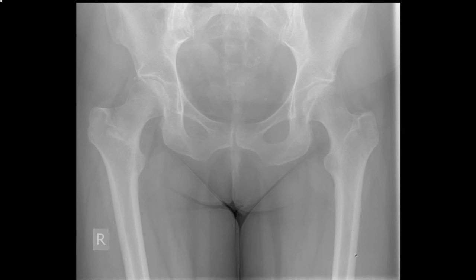On the left, normal shaft, good femoral cortices, lesser trochanter, greater trochanter, femoral neck, bony trabecular pattern intact, normal femoral head, nice joint, a normal left hip. On the right, however, normal shaft, greater trochanter, lesser trochanter. The trabecular pattern of the femoral neck here appears intact. Shenton's lines appear intact. Possible slight dip there, but it's very similar to the opposite side.